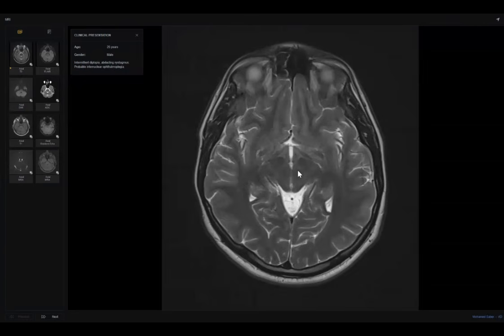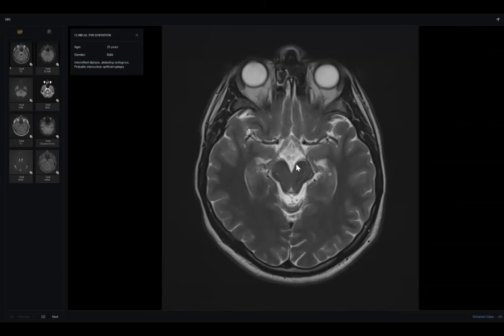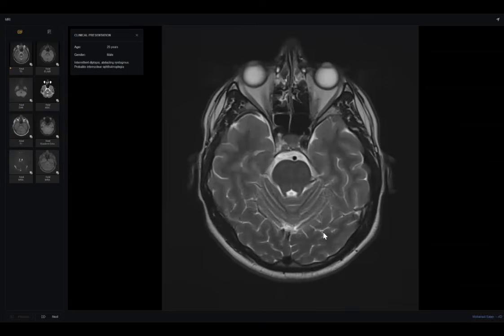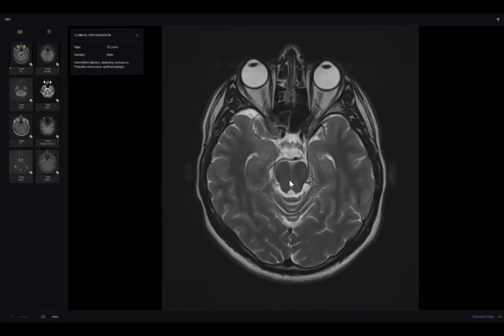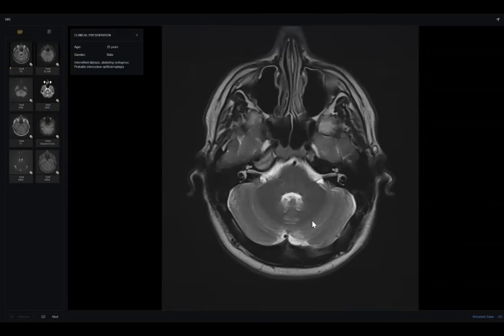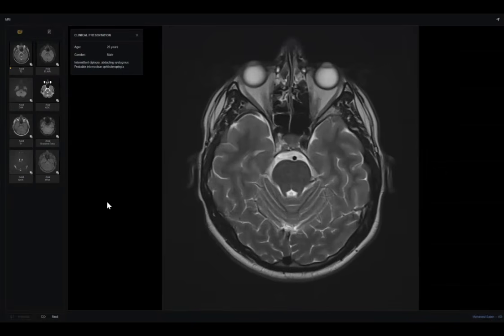You can't detect it here because this brain is not high resolution for the brainstem. A CISS image would be better to characterize the exiting nerves, which is heavily weighted T2, fluid sensitive, high resolution. See here at this level. So the trigeminal nerve may be best detected here.